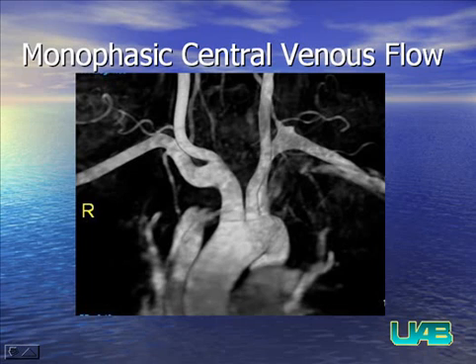But you can see here on this image at least, there is a long segment occlusion of the left brachiocephalic vein, and also no flow is visualized in the right brachiocephalic vein.